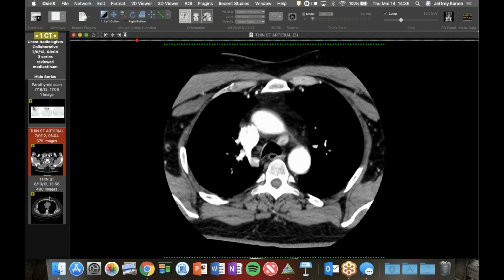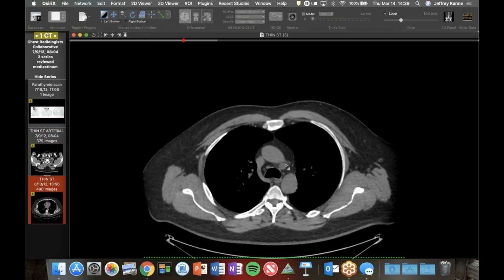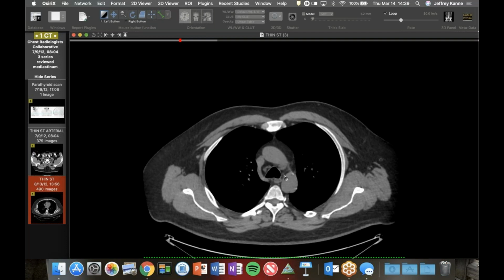But I think otherwise, I would have thought it's just a kind of plump lymph node. It's sort of oriented a little differently. Usually the long axis follows the long axis of the airways, and this one's more perpendicular to it. There's nothing about this, even that little lucent center makes it look like a lymph node. Very nice case.